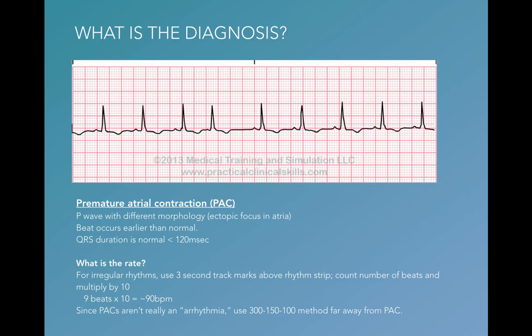The QRS duration is okay. The T waves are inverted, so that's an issue, but we don't know what lead this is in, and there could be some underlying pathology. But for now, let's ignore that. And we already went over the rate.